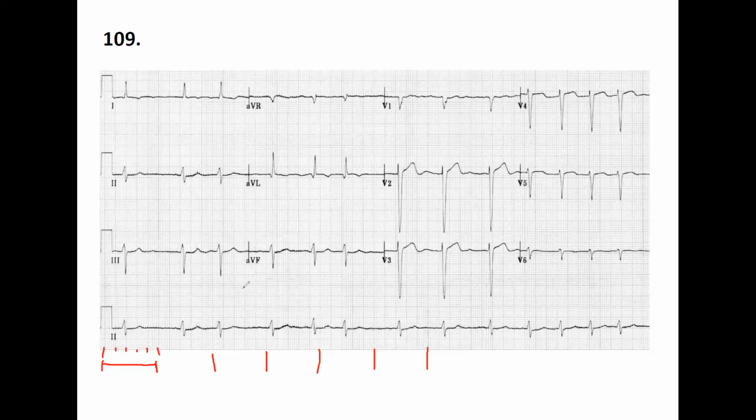Now, let's see this atrial fibrillation. So this is not a normal sinus rhythm for sure, but the next time we have arrhythmias. Maybe you do have it during the lecture, but we are not doing it right now. Okay, good. Axis.